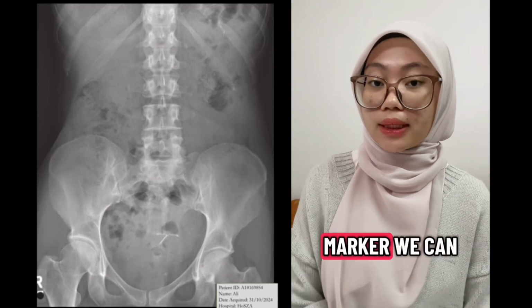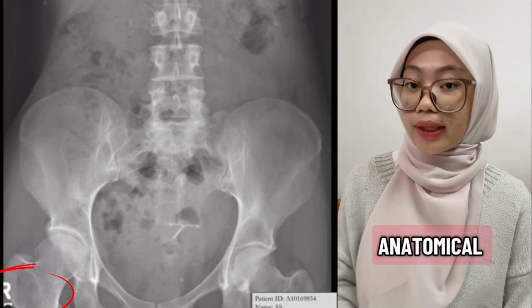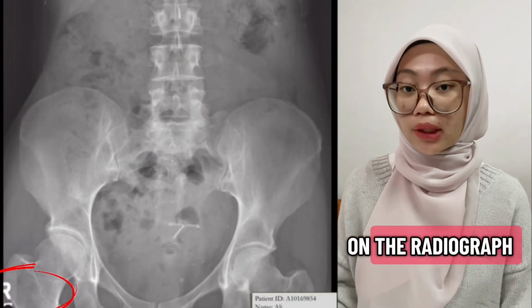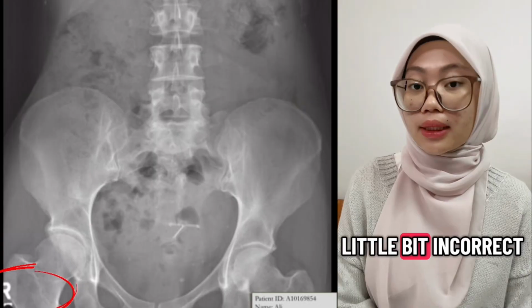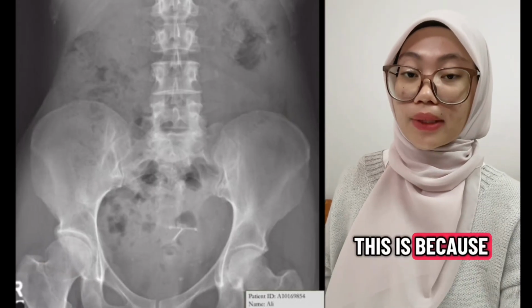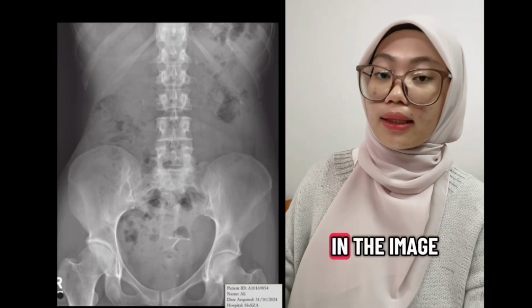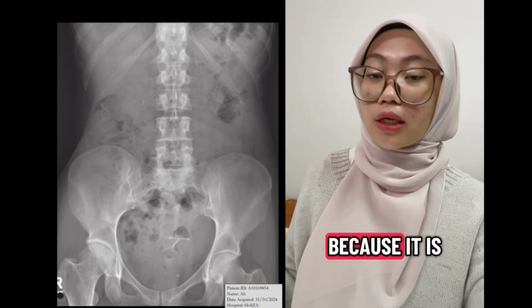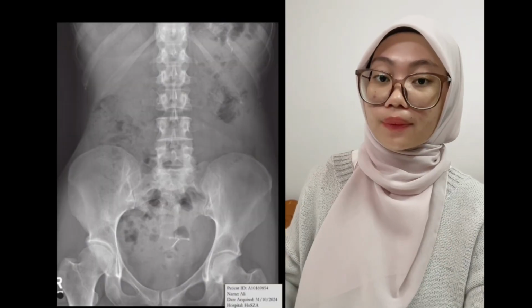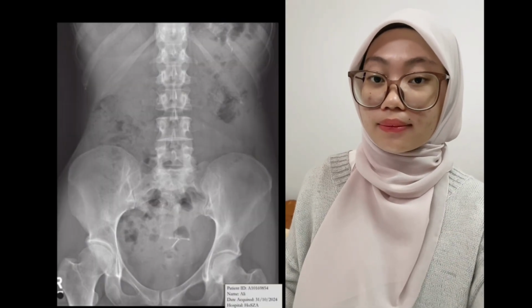Okay, for the marker, we can see the right letter of the anatomical marker on the radiograph, but the placement is a little bit incorrect. This is because the right anatomical marker is not clearly seen in the image, as it is cut off because it is placed at the region outside of the collimation.